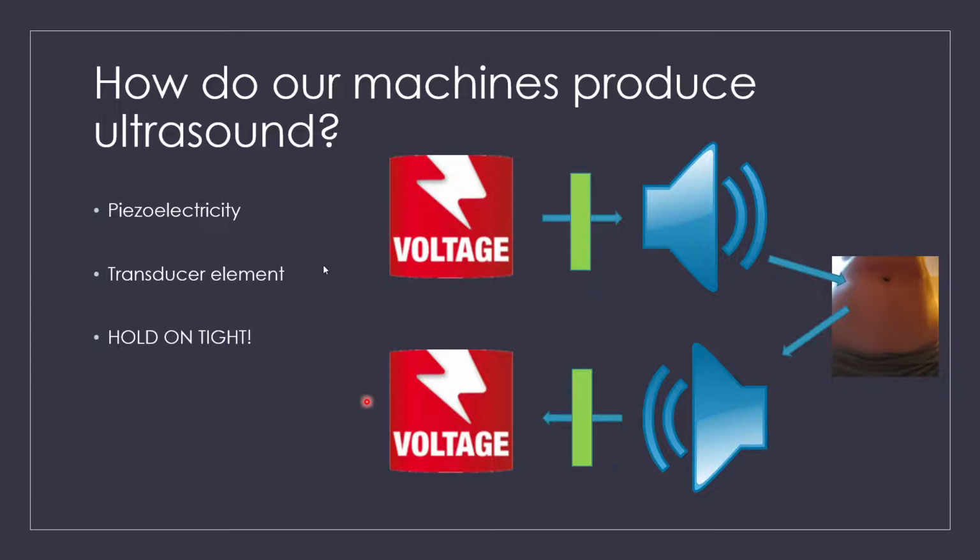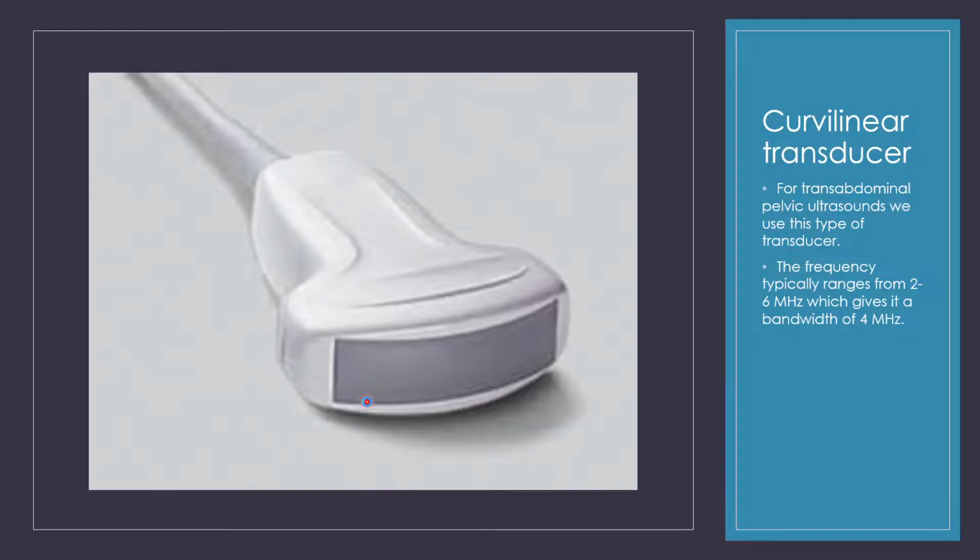Now these crystals are very delicate, so dropping that transducer can cause a degradation in the image, and it can cause black lines to occur, known as dropout. So hold on tight to that transducer and do not drop it.